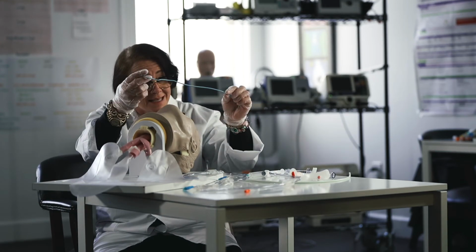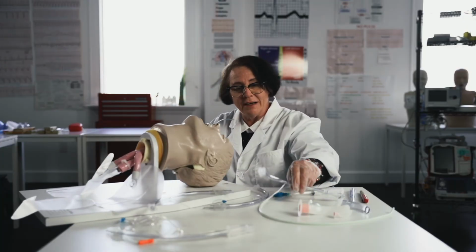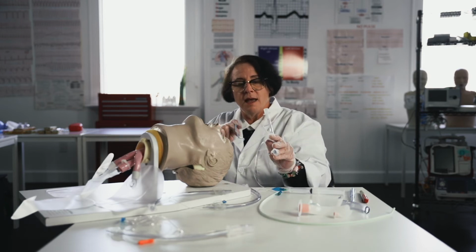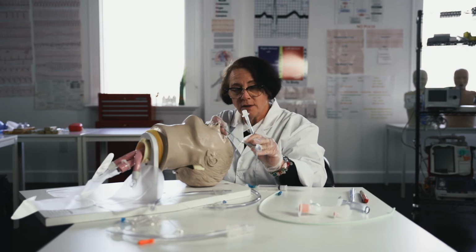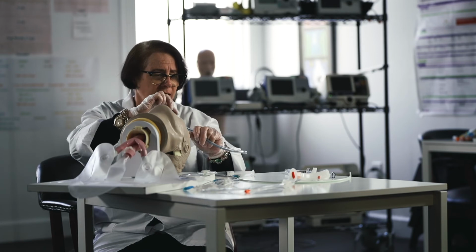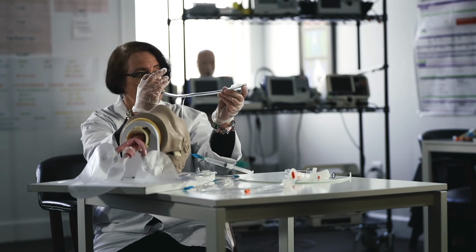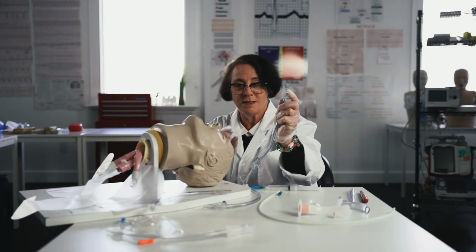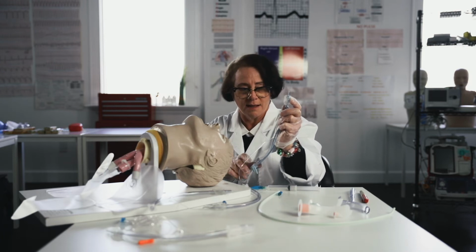Now, this is called a stylet. A stylet is like a coated metal hanger, and the stylet gives the endotracheal tube structure. If the stylet were to extend past, it could puncture on the way down. So whoever is putting in the endotracheal tube is going to place the stylet, and when they get to this little oval or the eye, you're going to see them curl the stylet so it doesn't extend. The stylet gives this structure, and once the endotracheal tube is properly placed, they'll pull out the stylet.